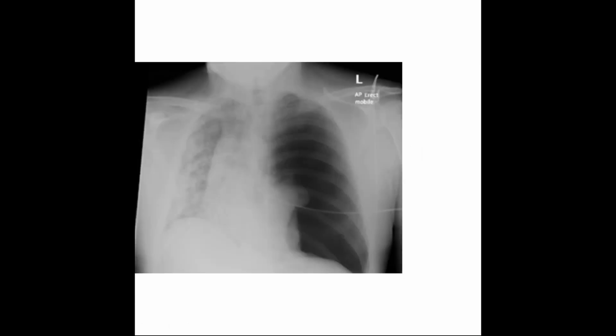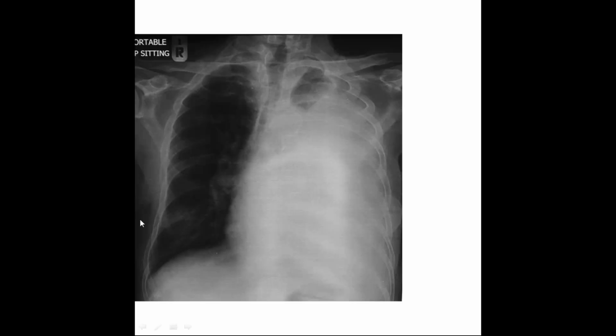Okay, now compare this X-ray. What is there in this X-ray? It is again an AP view. If it is only effusion, it depends on the involvement. If there is effusion on the left side, the cardiac border will not be that much affected. The effusion may be very huge, however, on the left side, if it is a massive effusion, you may not be able to appreciate the cardiac border. It is not necessary that a consolidation has to be there for the cardiac border to be obscured. But as you put forward, in this X-ray another differential could be a consolidation with synpneumonic effusion, apart from left-sided pleural effusion and empyema, as Rahul said.